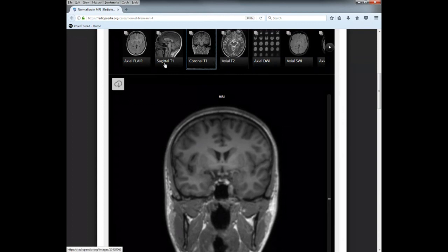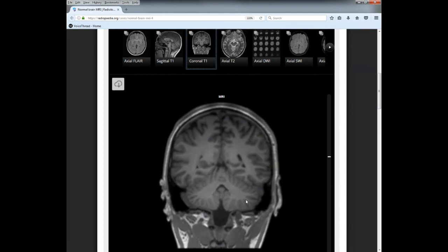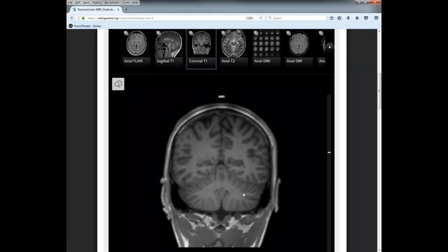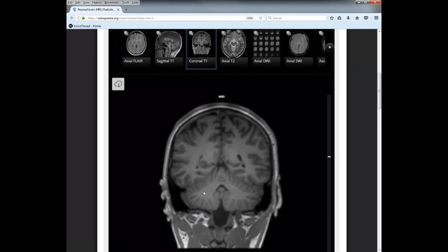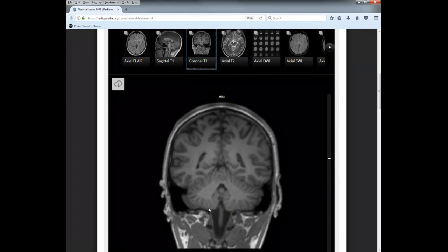Last but not least, we have the cerebellum. Okay, cerebellum back here. Here's this guy. 2 different hemispheres, right and left hemisphere. Actually, we have to talk about fissures to the meninges. Sorry. So we have the left and right hemispheres of the cerebellum. Okay, the little brain separated by the vermis right here. This is the vermis. Okay, it kind of looks like a vermis, right? Cerebellar tonsils right here. They even kind of look like tonsils. If you look in the back of your throat, they kind of look like that.